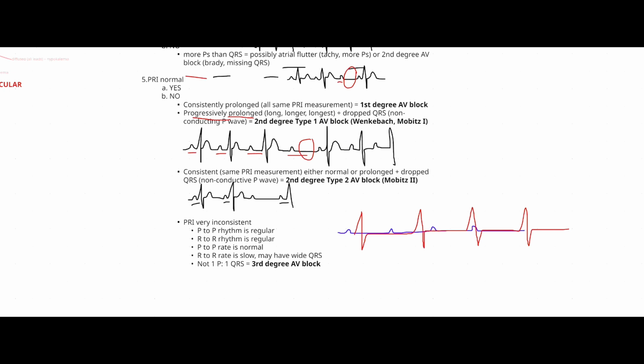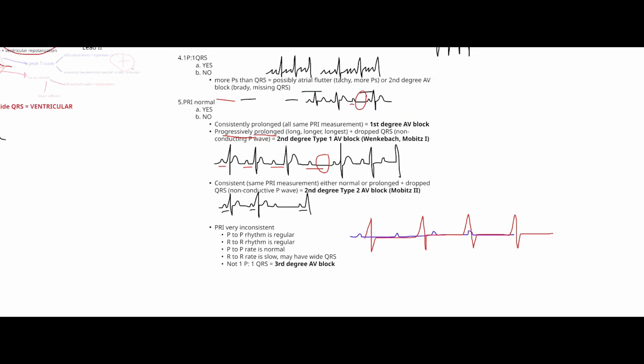And what's not being sustained? What is not happening when the ventricle is not contracting fast enough? No cardiac output, right? So that's why this is deadly. So this requires an internal pacemaker. Okay, and we'll go through that once we're done. We're almost done with analyzing our EKG because we're almost at the ventricle here.